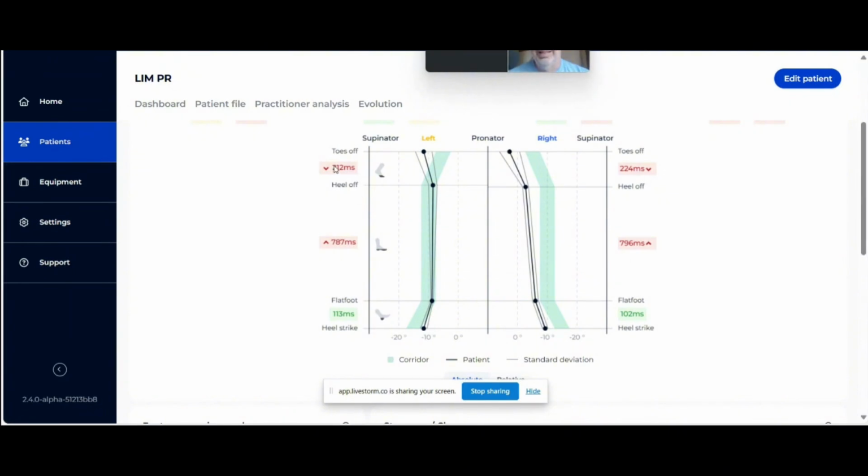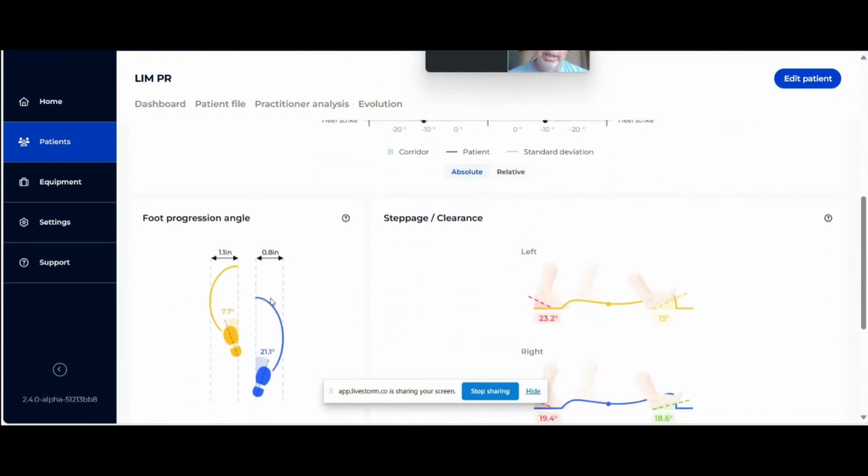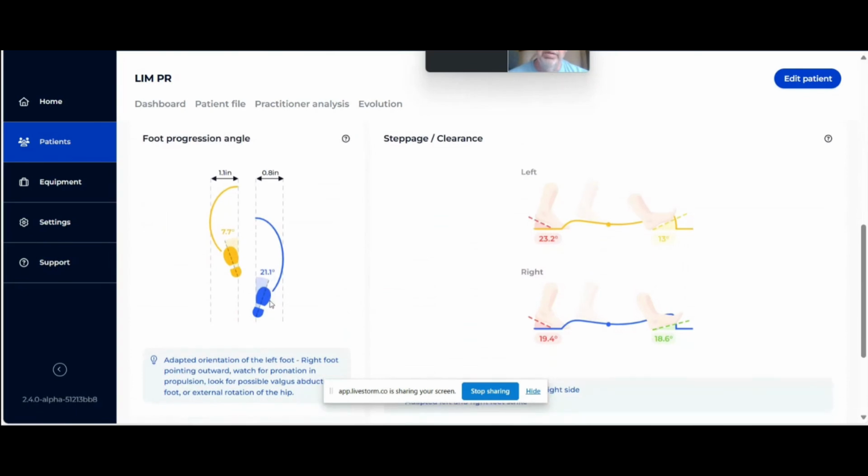So that tells me that it's not very strong, most likely. And again, because she's taking relatively short steps or strides with a really low duration with regards to that particular toe off. Sort of related to that is going to be the foot progression angle. So we look at asymptomatic people within two standard deviations is typically between about -2 to +12 degrees.